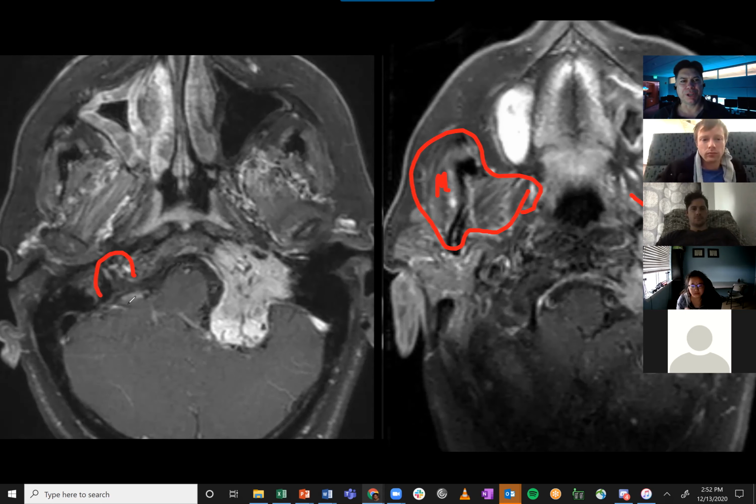But what is this guy right here, if this lesion is centered right there? Do you know what that is? Yeah, that's carotid canal. Well, the carotid. Ovale. Well, no, ovale is going to be up here. If you find your condylar head in the medial part, and you go a centimeter medial and a centimeter anterior, that's where ovale is. But what is this vein coming down that's around here?